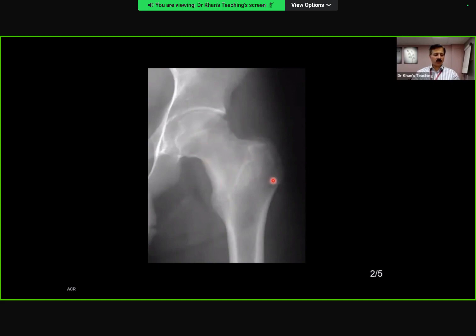Imagination, you are in osteoid osteoma. So there looks like, is there some soft tissue or like disruption of the fat planes around that. Okay, so you have picked up effusion. Well done.